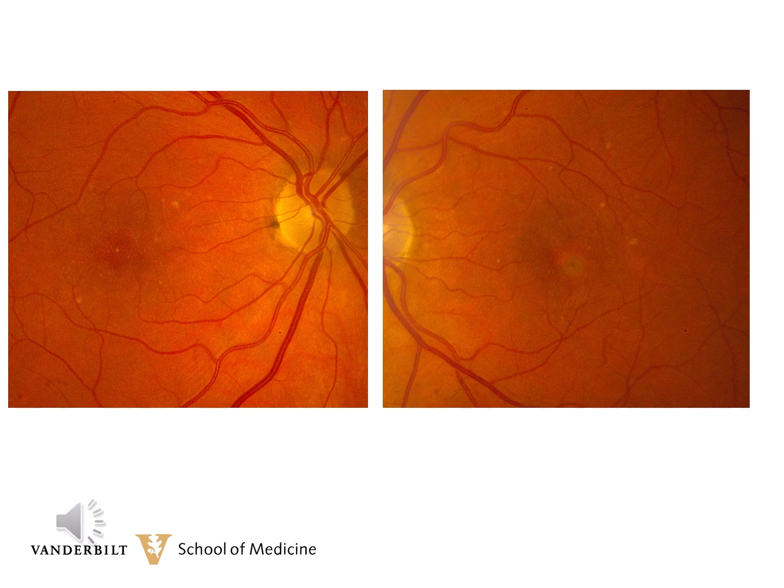In this patient, the right eye has some non-diagnostic RPE changes. The left eye has a very faint yellow lesion with a dark center, and there are also some non-specific RPE changes, maybe some drusenoid changes in each macula. It may be difficult to make a specific diagnosis based on the clinical appearance. She may have had prior inflammatory disease or possible old chronic central serous, just to name a few possibilities. We'll now show the OCT, and that will help you get the proper diagnosis.